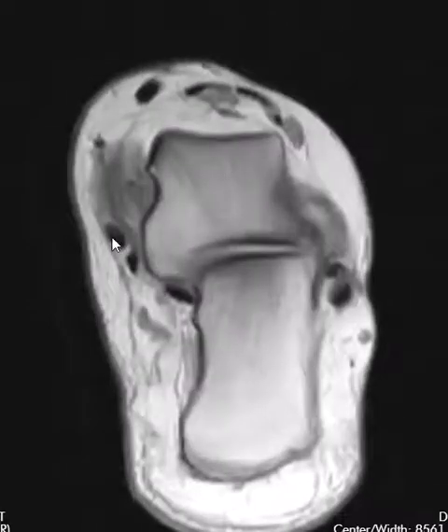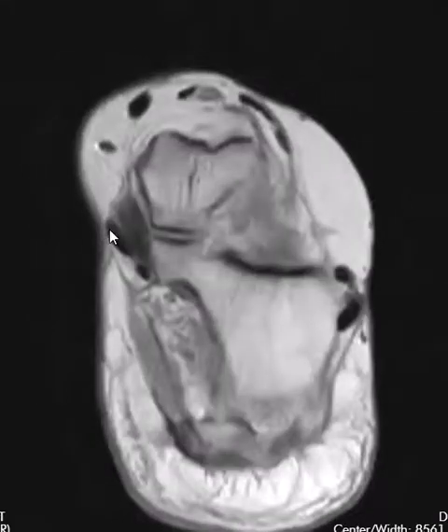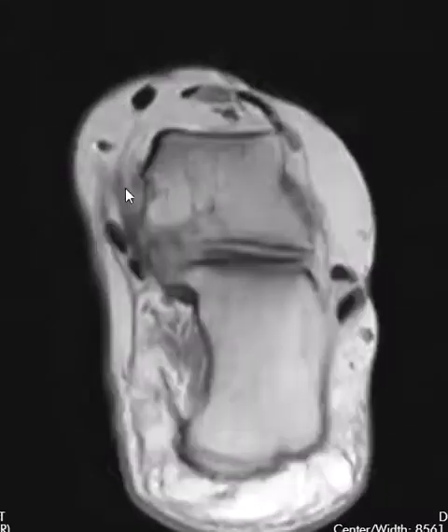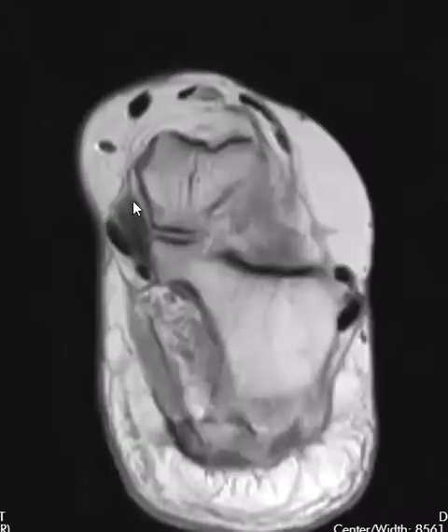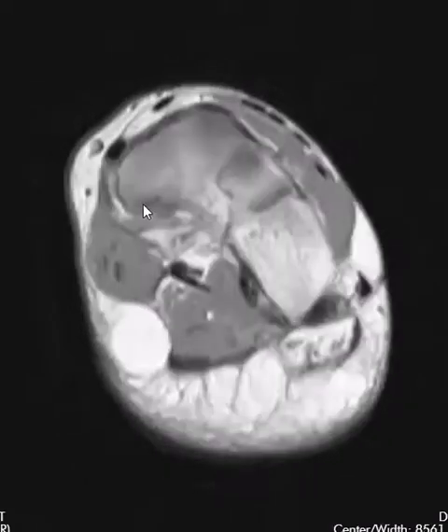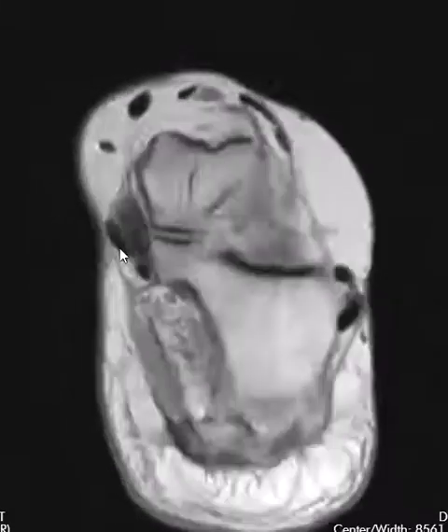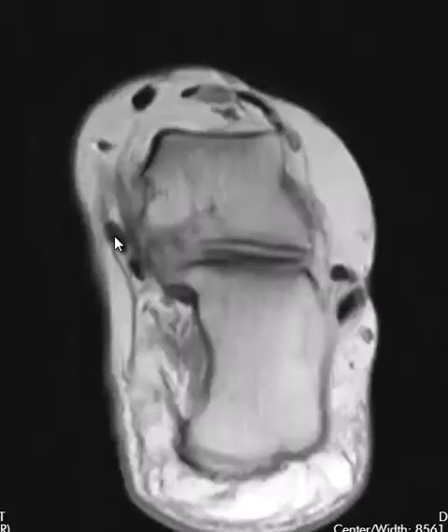So we have 1, 2, 3 on the medial side. The main one here is the posterior tibial tendon. And just medial to that we see part of the spring ligament here. This patient has kind of a thick spring ligament, and the posterior tibial tendon will come down and attach on the navicular bone, medial navicular bone. In this patient, looks like they may have a prior strain right there at the attachment. You can see this better in other images, but this is the posterior tibial tendon.